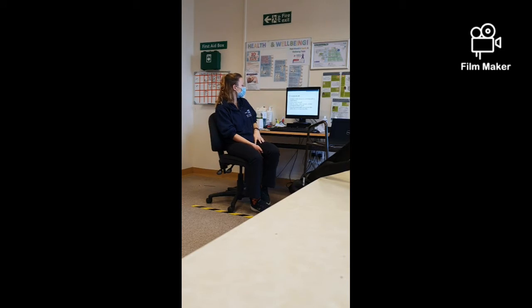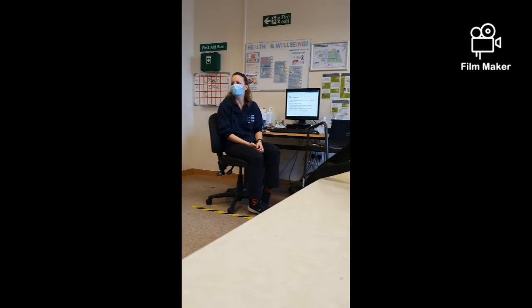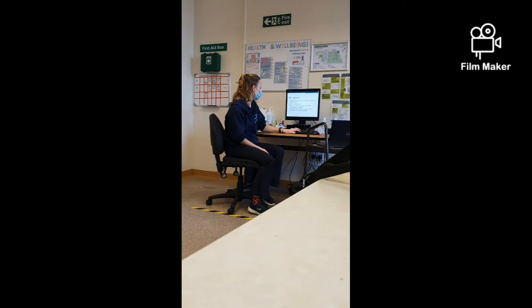We also need to make sure we can see the vertebral bodies through the heart shadow. That will tell you if we've got a good exposure. And you'll be able to see 10 ribs posteriorly on an inspiratory film. That is if the chest X-ray has been taken at a good angle, and it's a good chest X-ray. Sometimes if patients are in funny positions, you're not always getting a really good, clear chest X-ray.